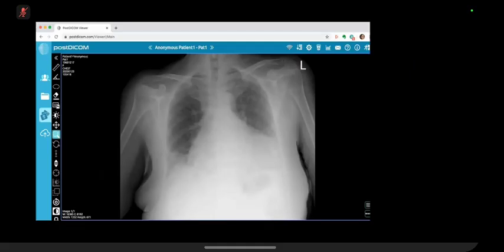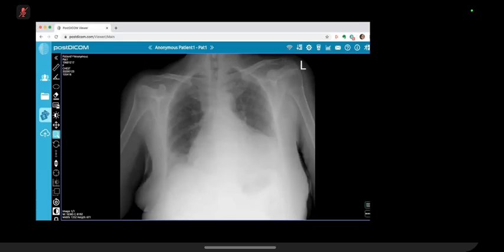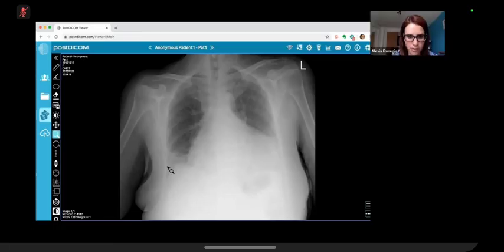Okay, so on this frontal chest radiograph for an adult female patient, there is an abnormality in the left hemithorax with a moderate to large volume left-sided pleural effusion. The right pleural space, I think, looks clear. There's possibly some consolidation or at least basal atelectasis at that right lower zone. And I don't know if this is projectional, but there's possibly also a small nodule in that right lower zone also. Are you referring to this?